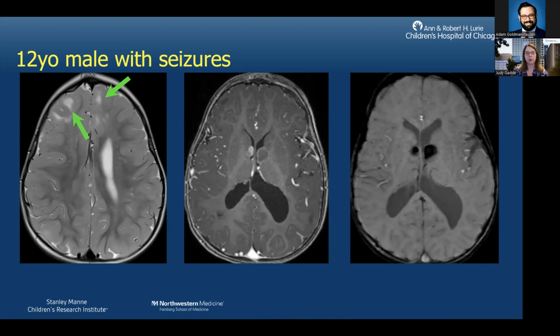And if you saw, I kind of skimmed over it, but on that list, it said cortical dysplasia and then had an asterisk. And these, we often will refer to as cortical or subcortical tubers on our imaging. But pathologically, if they look at these under a microscope, it looks the same as focal cortical dysplasia. These patients will often have multiple of these and they're bilateral, and this is what actually causes their seizures.